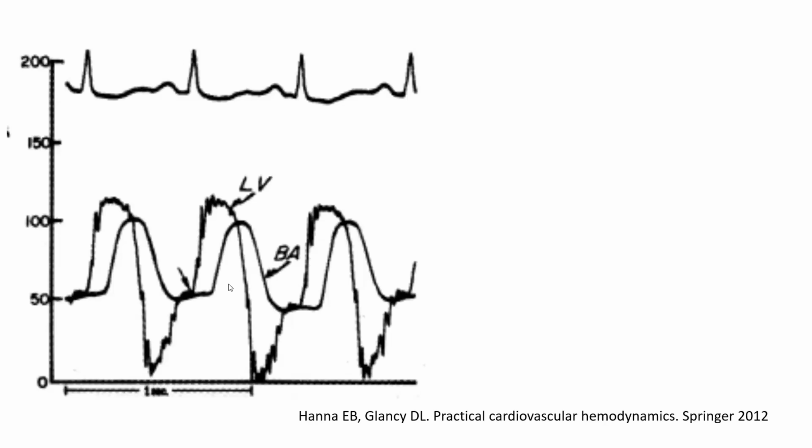But you get it in normal people, especially healthy normal people. The aortic pressure is 120, the peripheral pressure may be 130. So you can get amplification of 10 up to 30 millimeters of mercury, more so in severe AI. So the diagnosis here is severe AI.